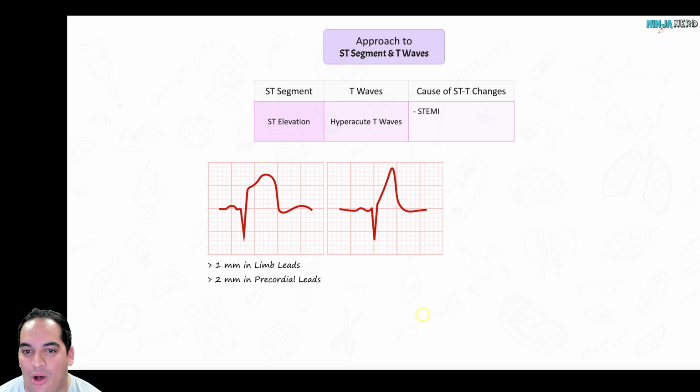So you see now why it's super important to see, oh, ST elevation, it's there, based upon the actual numbers of elevation above the isoelectric line. You see the ST segment, but then notice where it is. If there is that presence of ST elevation, what's the morphology? Convex, concave. It can provide some justification if it's truly more concerning for ischemia. Then look at where it is. Is it in the anterior V1 to V4, and does it have reciprocal ST depressions and T wave inversions? That could be an anterior STEMI.